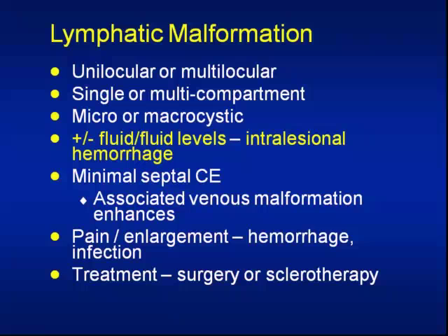If you have an enhancing component along with what looks like a lymphatic malformation, it's going to be either an associated venous malformation or what some are now saying just dysplastic veins along with your lymphatic malformation. But the lymphatic malformation itself is not going to enhance.